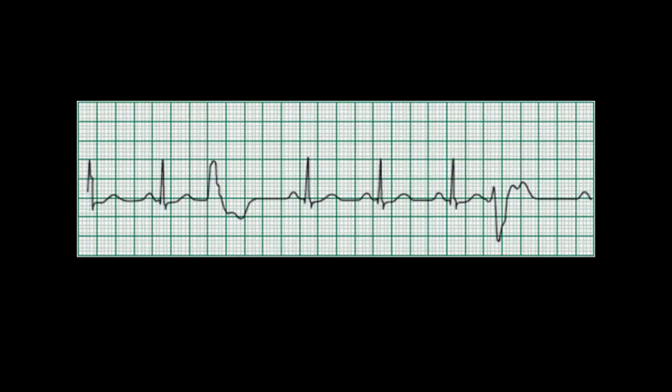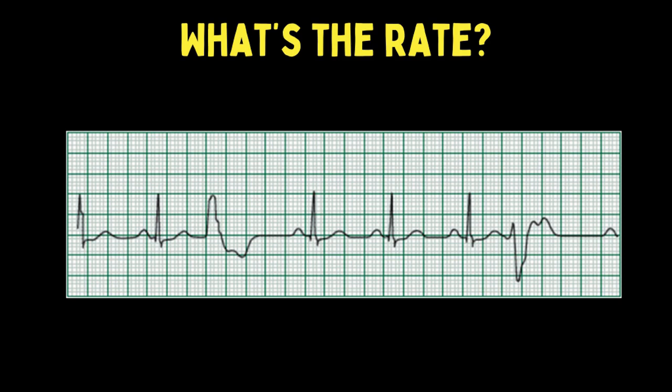So let's put it all together. Let's look at this strip. Again, trust me that it's a 6-second strip. What's the rate? Counting the complexes, I see 7. 7 times 10 is 70. Even I can do that math.